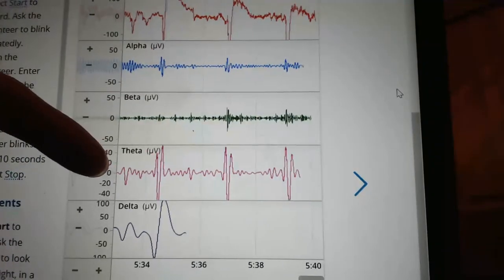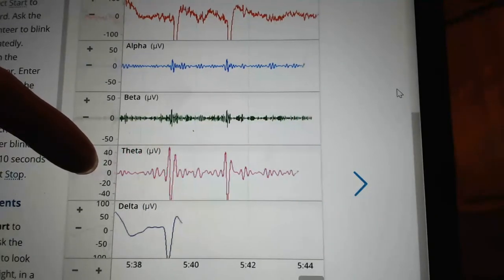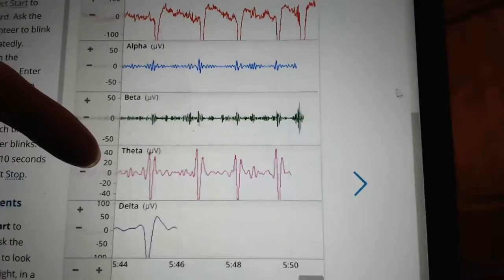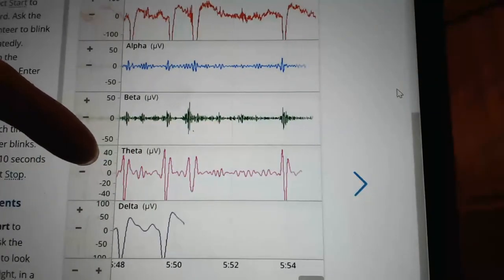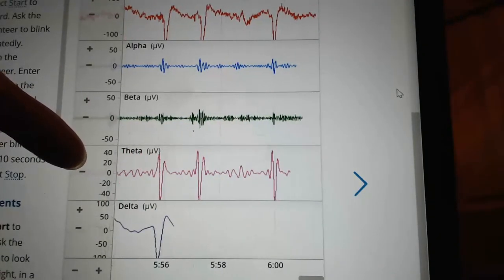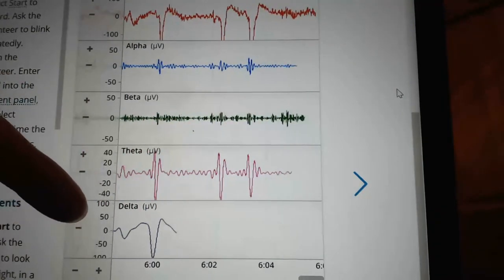Theta, we see in individuals when they are just falling asleep, so like stage 1 sleep. We might see it in practiced meditators, possibly. So it's an interesting type of brainwave associated with certain states like deep meditation, a light sleep, daydreaming, like that. And then delta waves.